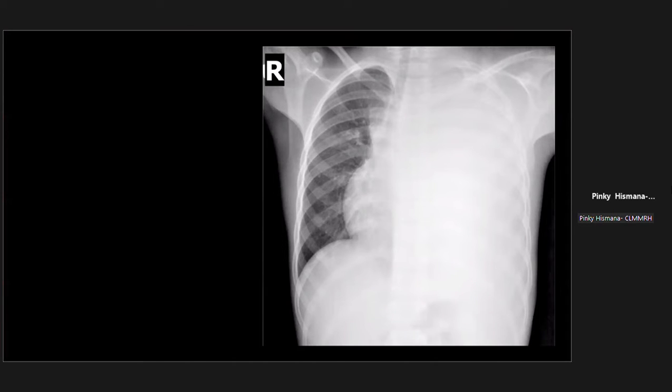If your lung collapses, let's say the left lung collapses, your mediastinal structures or your heart, isn't it more on the left? Will it go more to the left or more to the right if it collapses? To the left, doctor. To the left, okay. That's because it collapsed, right? So its volume decreased, and it is displaced ipsilaterally. So in this case, is it ipsilateral, meaning the same side? Is the heart going to the left or to the right? To the right, doctor.